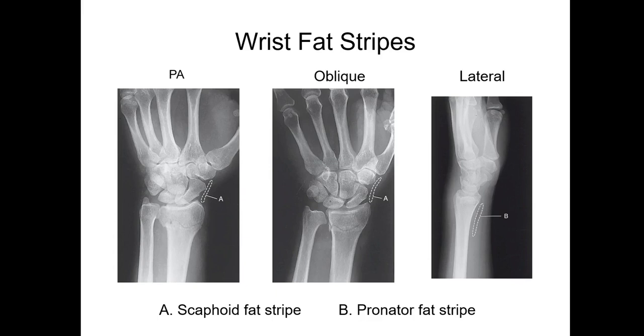All right, the fat pads are radiolucent, which means that they're only slightly different in tissue density, which makes them really difficult to visualize on radiographs. So they don't really show up as radio-opaque structures like the bones. That's really important for us to realize because we have to make sure we're not over or underexposing our joints, specifically our techniques, our kVp and our mAs. We want to make sure we have optimum exposure to visualize all of the soft tissue structures.